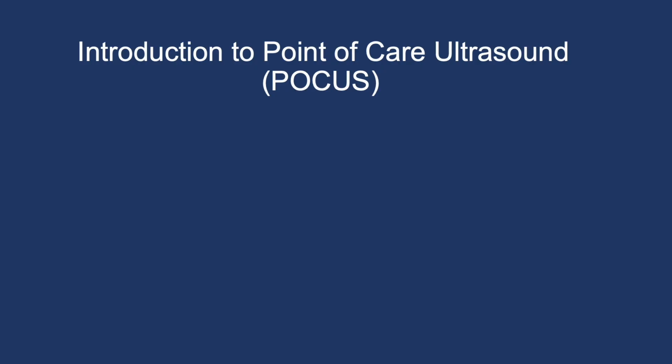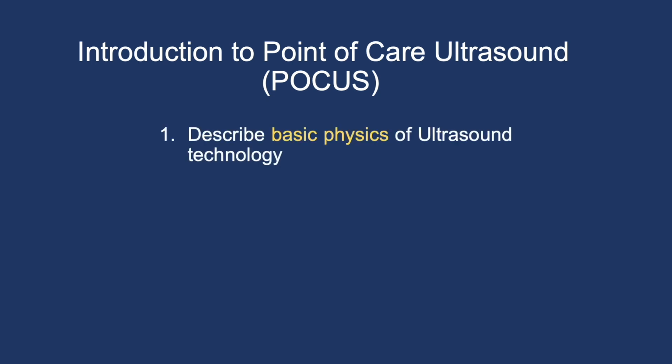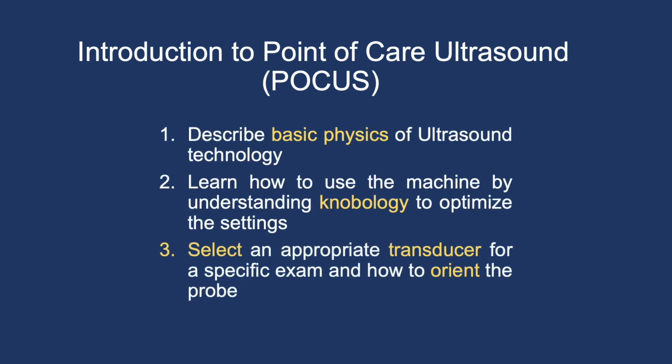Welcome to our Beginner's Fundamentals of Point-of-Care Ultrasound. In this video, we're going to delve into medical ultrasound and explore the physics, the knobology, probe selection and orientation, and vocabulary that you need to know to get started with POCUS. Whether you're a medical student, a resident, or a seasoned clinician, understanding these basics of POCUS is essential for providing high-quality patient care. So let's get started.